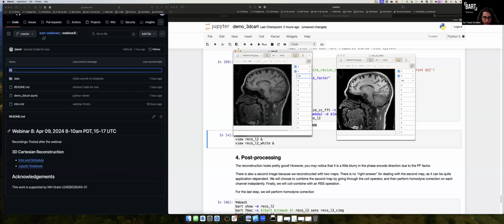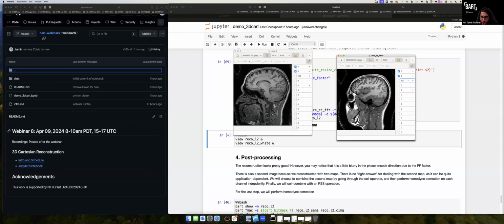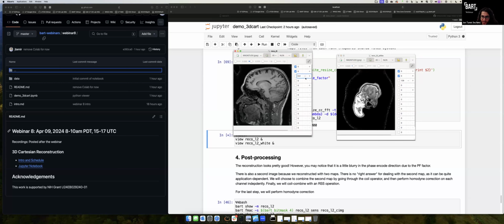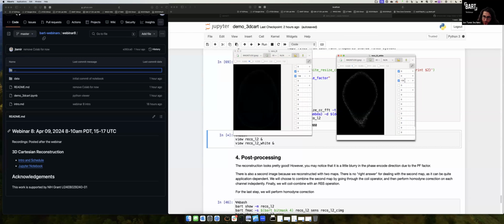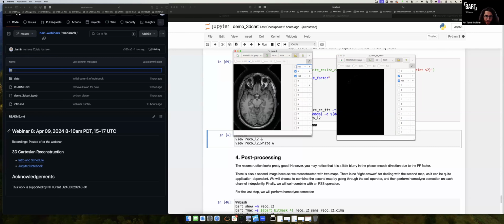Okay, so here are the two reconstructions. Is there a significant difference? Maybe there will be on specific slices where that particular channel had more noise amplification, but it may be very subtly different, because in this case the coils are not too bad. So I hope that answers the question. I'm happy to link to an example where there's a more pathological issue, done by Michael Hansen in a sunrise session at ISMRM, that shows what really can go wrong if you don't noise pre-whiten.